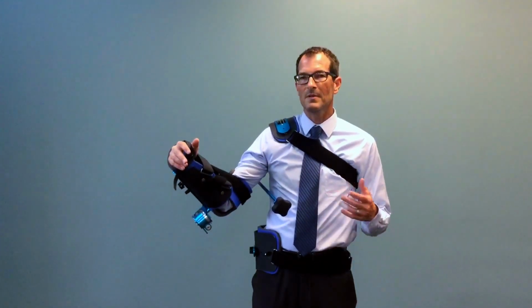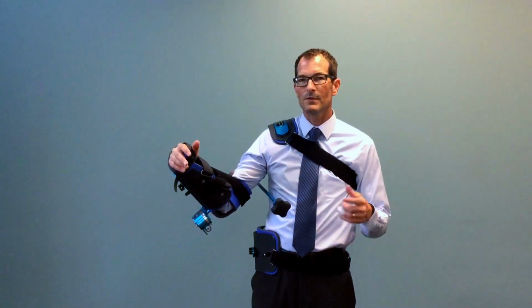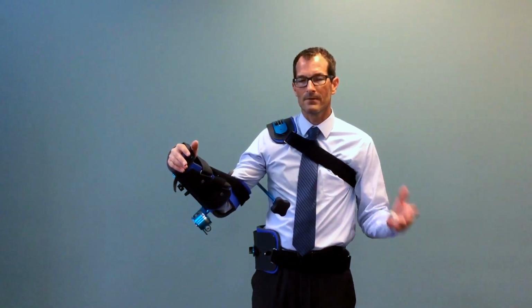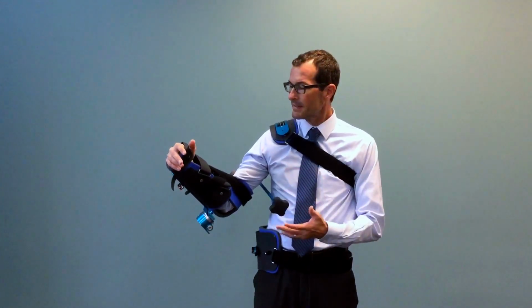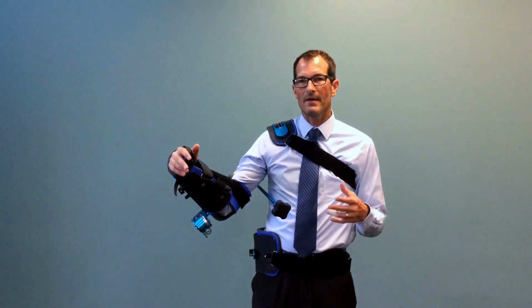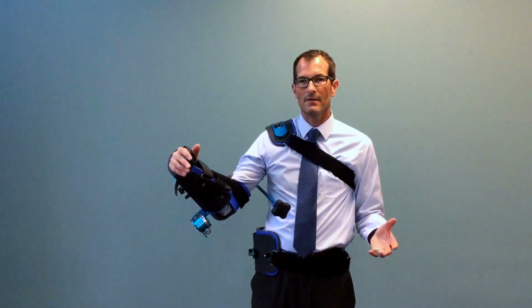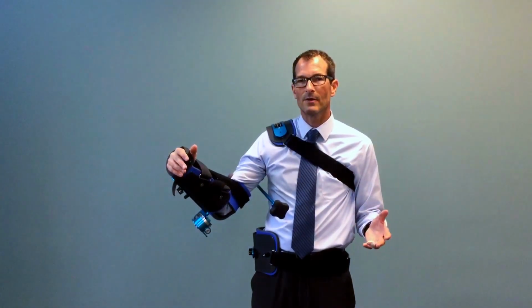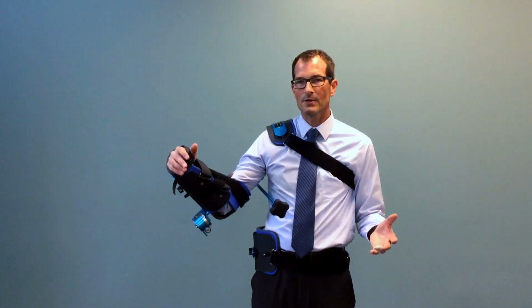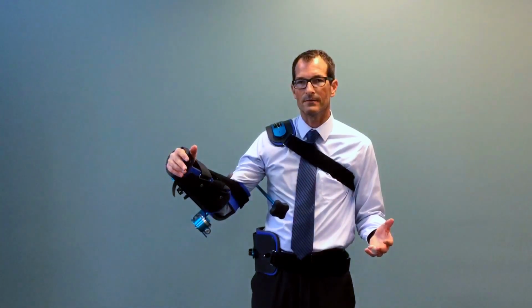So if your product goes beyond the anatomical norm, we can make sure that we achieve true anatomical norm for that patient. Secondly, if the patient's arm is larger and they have a lot of soft tissue displacement, we call that soft tissue give, that can also throw off your range of motion numbers on the actual device. So the Stat-A-Dyne shoulder goes beyond anatomical norm to overcome mechanical and soft tissue give.